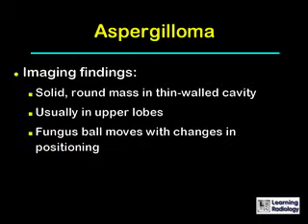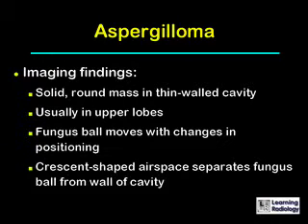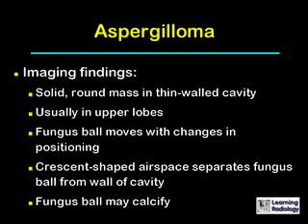The fungus ball can move with the change in positioning of the patient. That is one of the ways to differentiate between a fungus ball and a tumor. And the crescent-shaped airspace above the fungus ball separates it from the wall of the cavity. Fungus balls rarely can calcify.